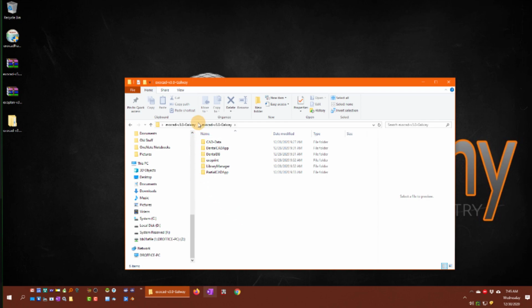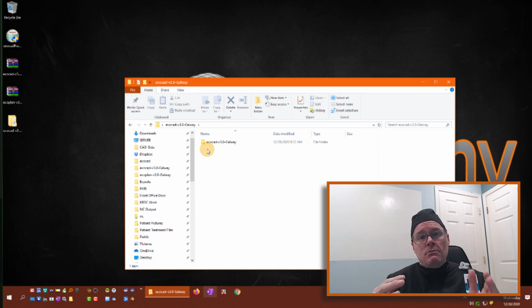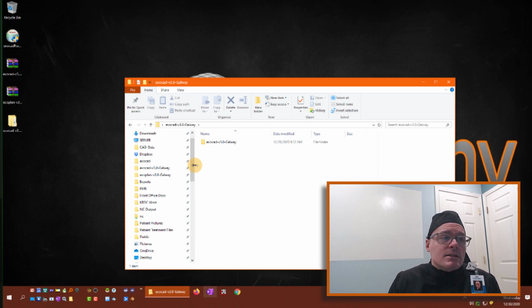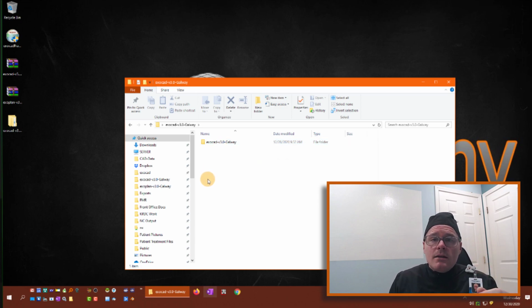The first thing we're going to do with this folder is move it to where we want it to eventually end up. For me, because I use a couple different workstations, I have a couple different license dongles. I want to have a common network folder for all of my cases. So I need to do some configuration, and I need to move that exocad folder. I would suggest making an exocad folder in the C drive, and then if you'd like to keep different versions of exocad, keep them within that exocad folder.